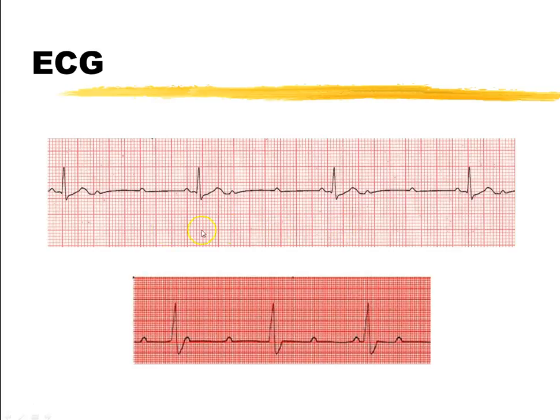Now it's kind of confusing because look, here's a semi-normal looking PQRST complex. All this together looks normal, right? So does that one. So does that one. It just happened to be hitting on it. But you can tell there's no real relationship between the two. Down in the bottom one, same sort of thing.